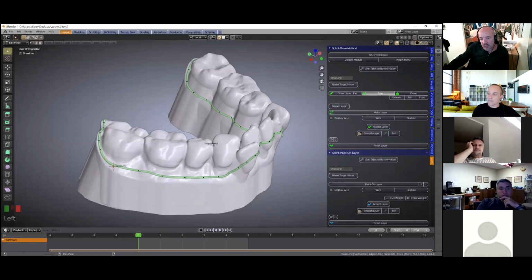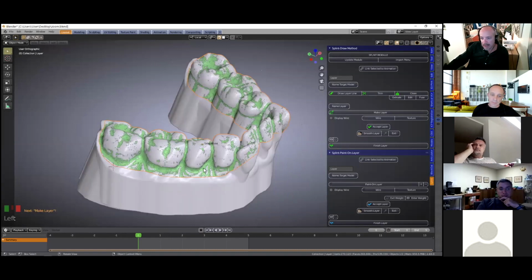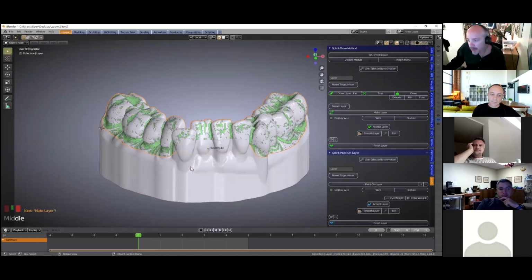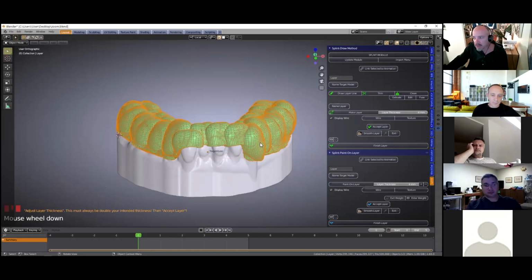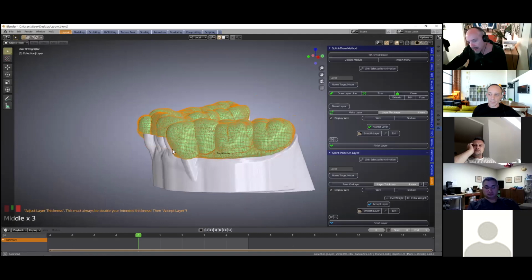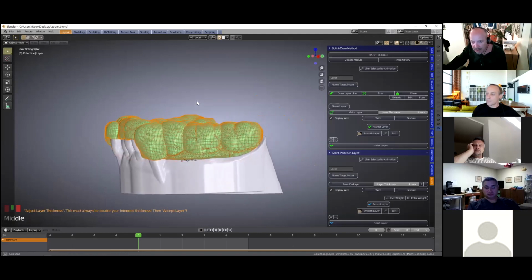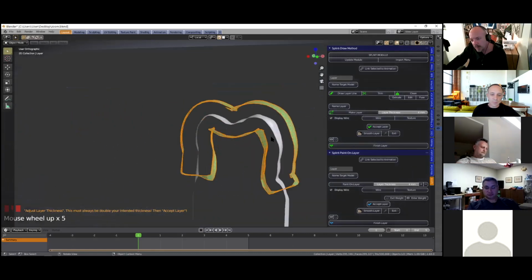So we'll click trim, select from the mesh you want to keep, and then click on clean. This gives us another layer over the top, and you'll notice that it is called layer, so always make sure that it's correct. Then we're going to click on make layer. This gives us a solid layer, and it says 4 millimeters. It is 4 millimeters because it goes inside, so from one wall to the other, it's 4 millimeters.